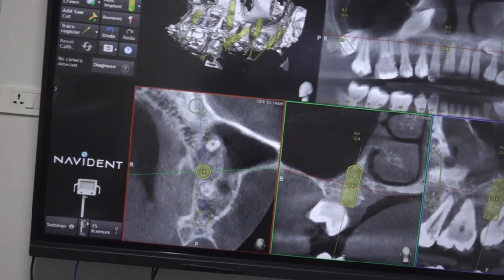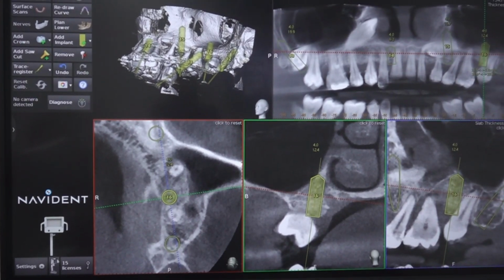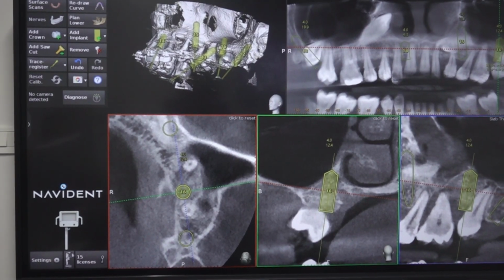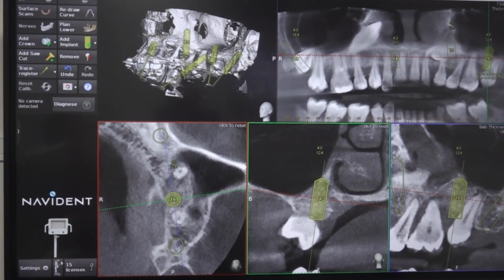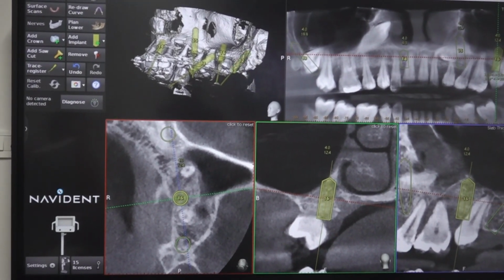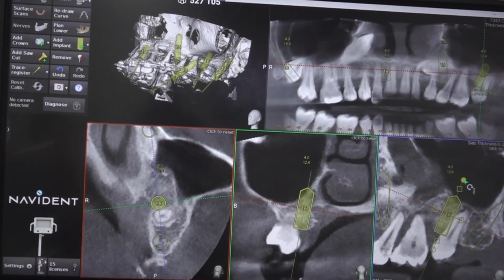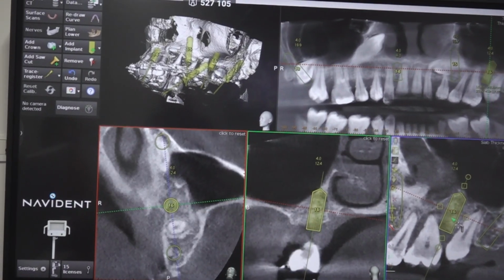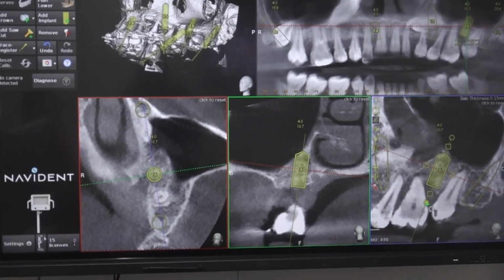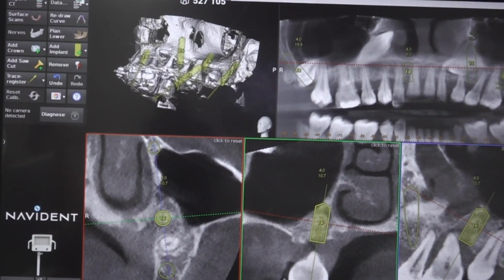There is no great advantage in placing this implant in between. This pterygoid is more than enough to take the load, and this one buttress is enough for that segment. So there is no great advantage in placing this implant. It will complicate the prosthetic procedure actually. This scan body will come easily. This scan body, no. There is no big use here. Maybe we can tilt it slightly so that both the pterygoid and the smaller implant will tilt.